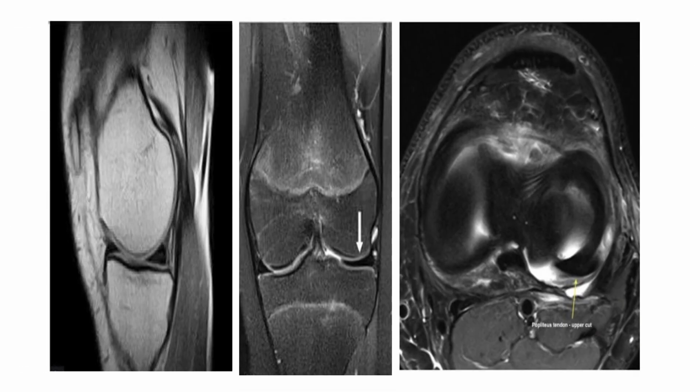The importance of MRI is to evaluate the meniscus in different planes, to visualize the different parts from different aspects of the meniscus. Like sagittal MRI shows the anterior horn, posterior horn and body. We can see here this is the anterior horn, this one is the posterior horn. Body is not visualized in this image, and this thick anterior structure is the coronary ligament that attaches the anterior horn of the medial meniscus with the tibia.